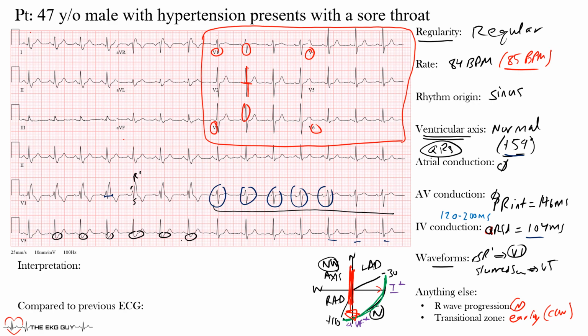Now these last two things, I always mention that these depend on lead placement. So again, it depends on who's putting leads on. This is a very imperfect science. So it can be helpful, but don't put too much reliance on them. Okay, but it can be helpful at times. All right, so that's that.